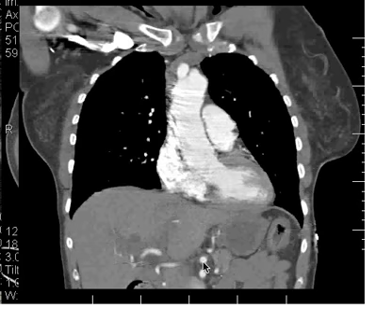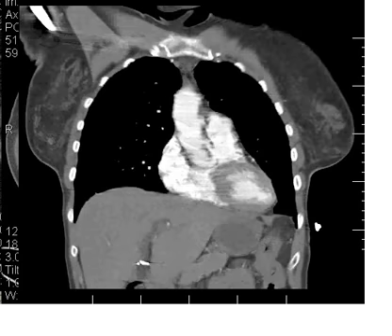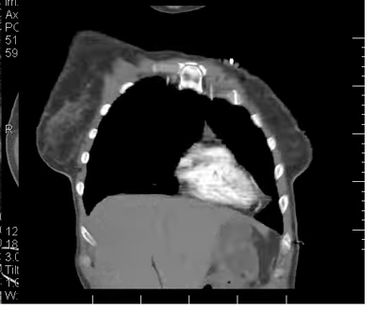Well, let's just look at this. Where's the left ventricle? Here it is. Here's the thick myocardium of the left ventricle. Here's the left ventricular chamber, and that is exiting as the ascending aorta. And here you can even see a branch vessel coming off the aortic arch. So that means more anteriorly we should see the right ventricle, and here's the right ventricle. Remember, it's more anterior than the left ventricle.